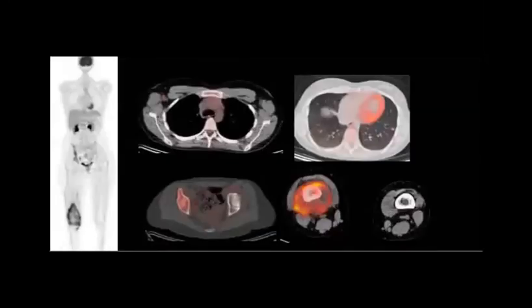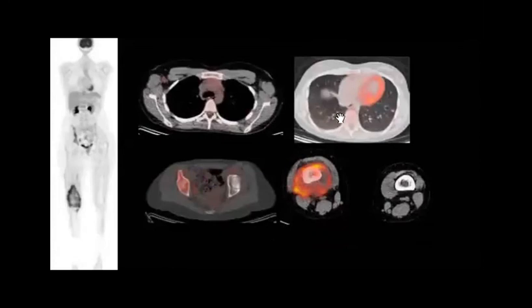I don't think that we can take this patient already. Okay. We have 2 minutes. Okay, we can take it quickly. I think this one is an easier one. We can finish with it. Just the most important thing is to mention the metastasis.